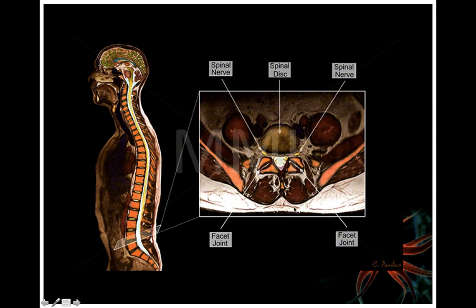Okay, so if you're looking from the feet, you got feet sticking out like this, and you're looking up into it, what you're going to see are the pelvic bone on the side, because this is way down in the pelvis. Usually when you palpate the sides of the top of the pelvic bone on the hip on an individual, that usually corresponds to the L4 level. And so this is the L4 level, this is L4, L5, so the L4-5 disc. We're cutting through the disc right here. And so you got the pelvic bone.